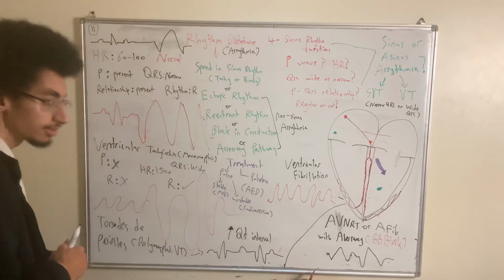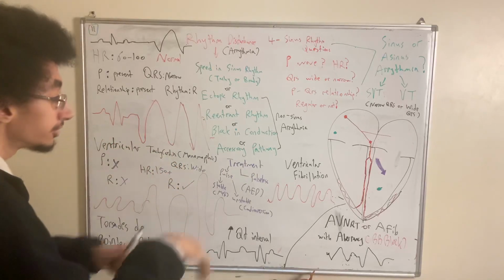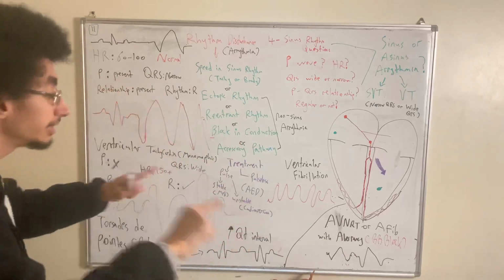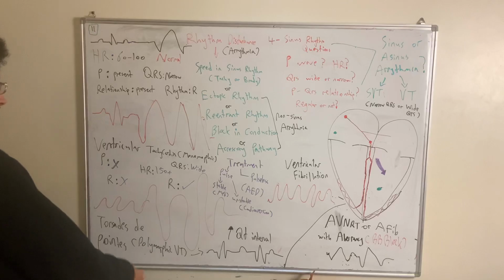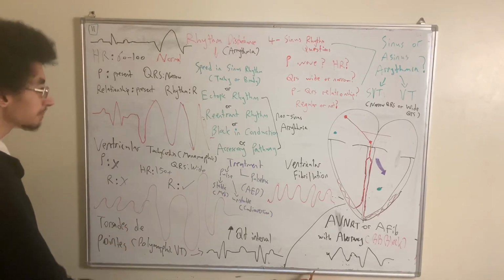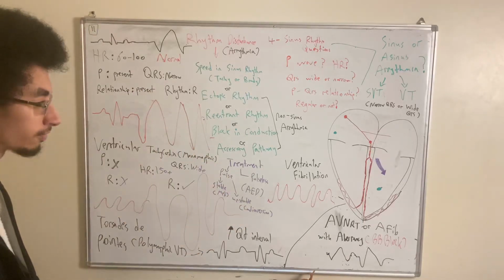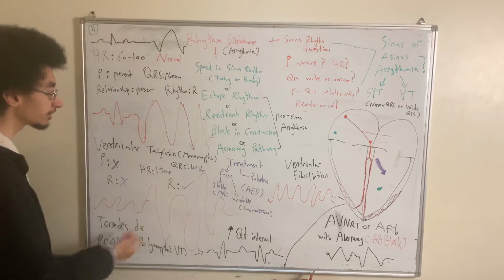development of ventricular tachycardia. Or let's be more specific here, this can lead to the development of not just any ventricular tachycardia, this can lead to the development of polymorphic ventricular tachycardia, which is Torsades de Pointes. So Torsades de Pointes occurs in people in which you can see on an EKG prolonged QT interval. And you can see the appearance of polymorphic ventricular tachycardia.